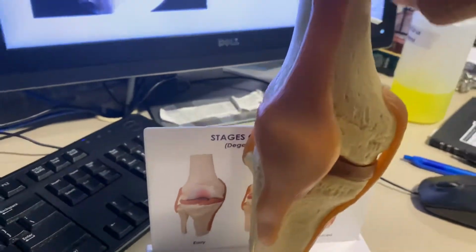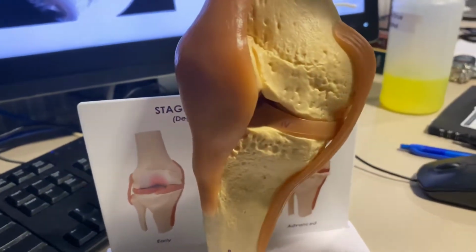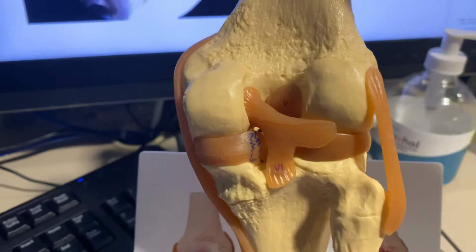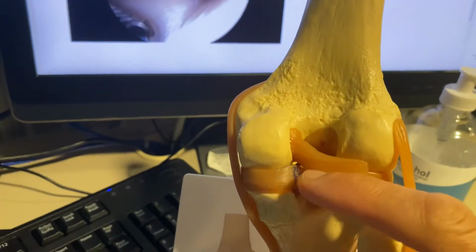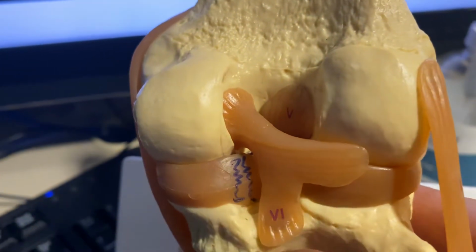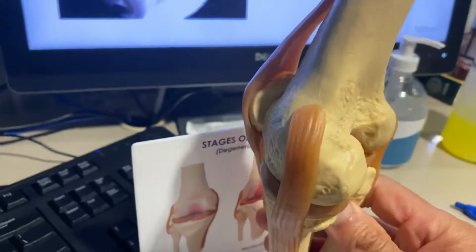And if we look at a model, what is it that we're actually looking at? It's going to be kind of hard for me to show you, but this is the patella, medial meniscus. Let's go all the way around. Let's take it around to the back of the knee. And I kind of marked off where the meniscus tear is at. When it's a root tear, it's almost there. But you see how the PCL is right there? And right next to the PCL is the root. And when there's a tear, there's a gap. Okay, there's a gap, just like I drew right there. And that's what we look for on the MRI.